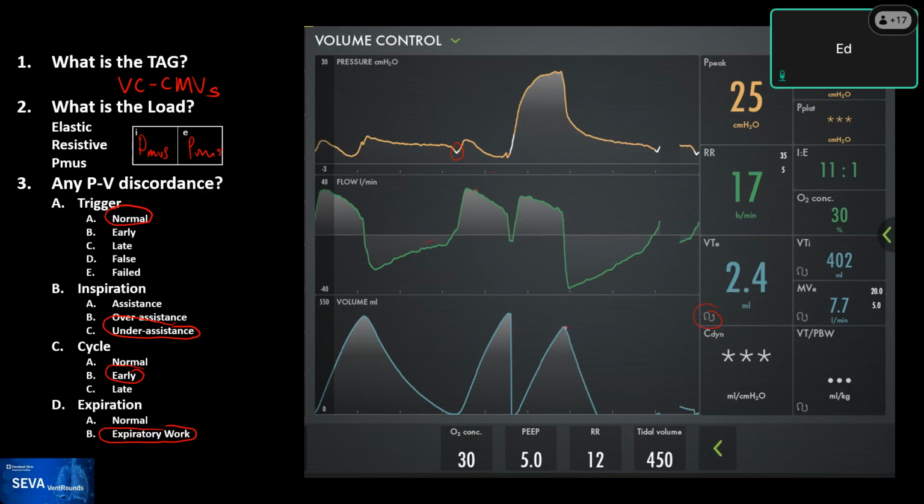And now the patient exhales, and actually it's exhaling with expiratory effort. You see the activation. And the patient exhales obviously more than the second breath. And now if this allowed you to see it, this patient is probably exhaling all the way over here, and then it resets and another breath starts. That's how it happens. Roberto?